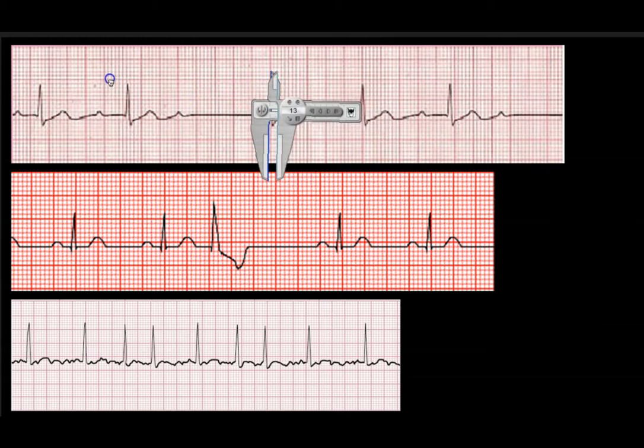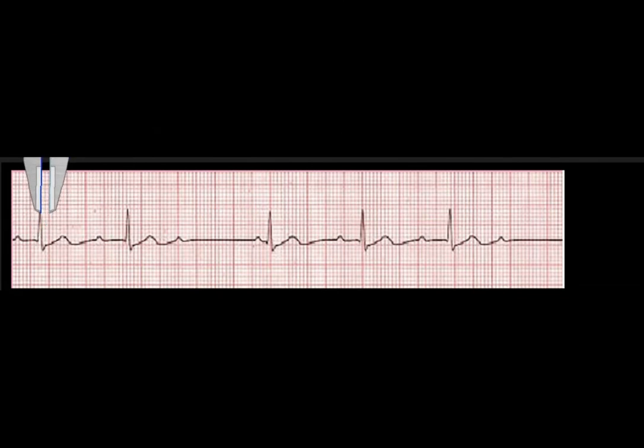But when we bring our calipers in, one of the things that we're taking a look at in this case is that if I look at EKG strip number 1, what I notice right away is that it is irregular because it looks like I am missing something in here, and it looks like I'm missing something in here. So those are things that I definitely need to make sure that I'm going to account for. So it is irregular, and I can tell that right off the bat just by taking a look at how this is occurring just off of the paper, right?